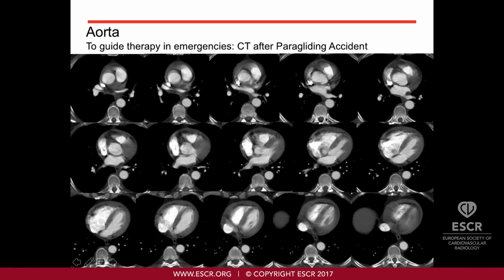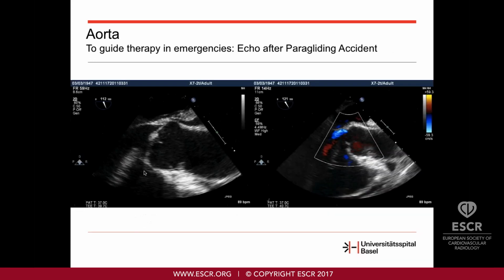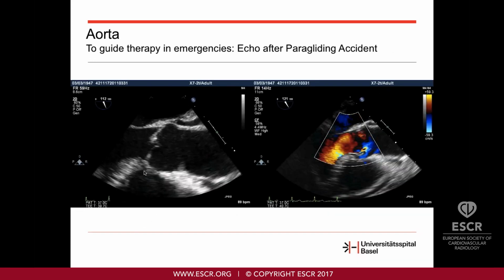This is another interesting case I would like to share with you. So this patient came from an outside hospital with these CT images with the diagnosis of intramural hematoma. We discussed it with our cardiac surgeons, and well, let me tell you what we thought about it. Here we see this elevated density in the wall of the ascending aorta.